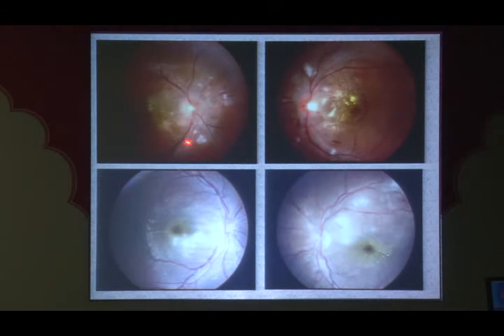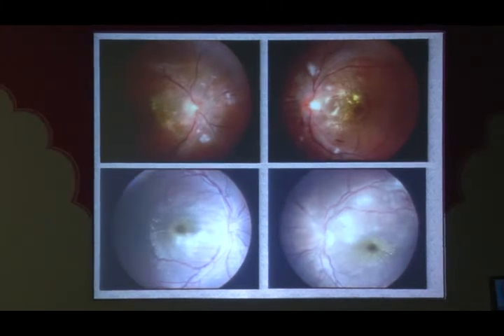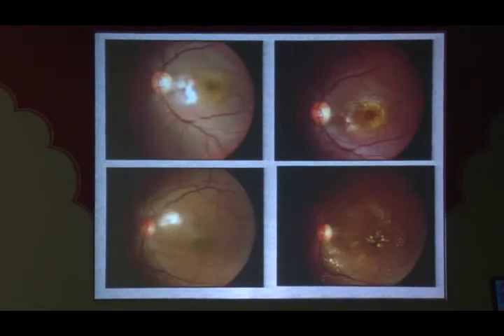It can be associated with vascular anomalies in the form of arterial narrowing in hypertensive retinopathy, or it can be manifesting more after the acute disease process has resolved, as in this case of a post-viral neuroretinitis. After the initial lesions have healed, the hard exudates have become more pronounced.